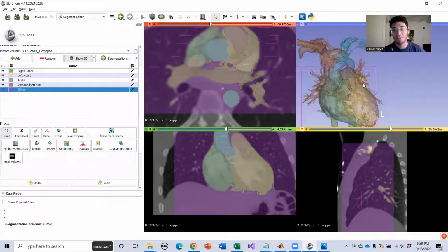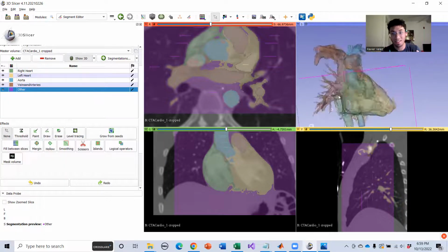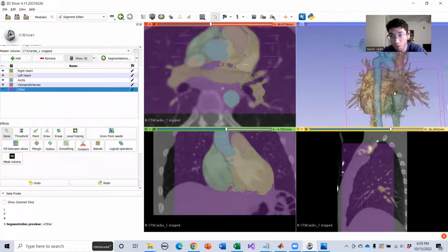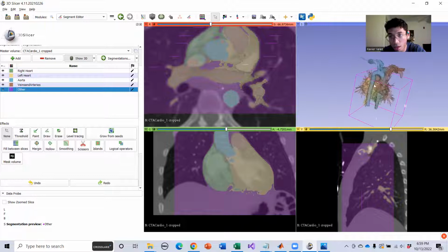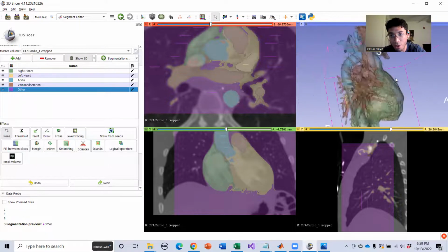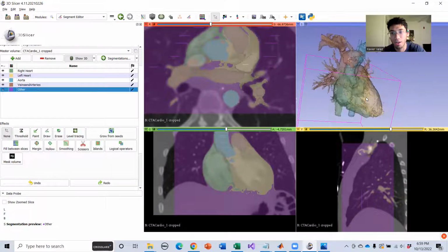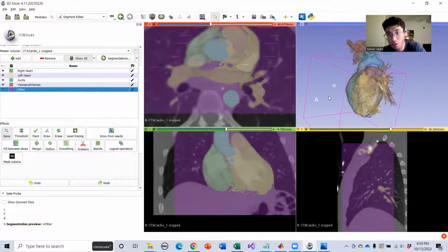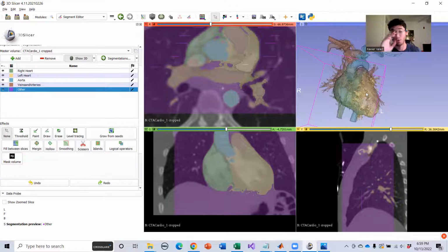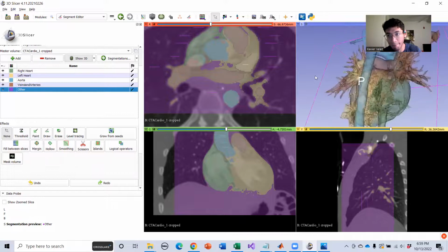So now that we have this, we're like, okay, that's kind of cool. It's a mess, but it's kind of cool, right? You can clearly see the blue is our aorta, the red are the rest of our pulmonary veins and arteries, and vena cava and cave. I'm realizing I don't know what the plural of that is. But regardless, it looks okay. Obviously this is not how we want to finish this, but for a rough start, honestly, it ain't too bad.